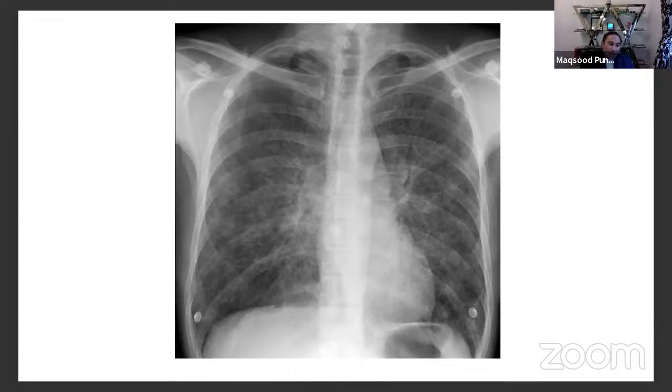This gentleman presented with myeloma, and he's on chemotherapy with cyclophosphamide, lenalidomide, and high-dose dexamethasone. When he came to the clinic, he was quite short of breath and just had a dry cough, wasn't coughing out anything. I don't think I'll give more clues at this point. But anyway, we sent him for a chest X-ray because of the shortness of breath to see what exactly it looks like. And this is the chest X-ray. Could you kindly tell us what it shows, please?